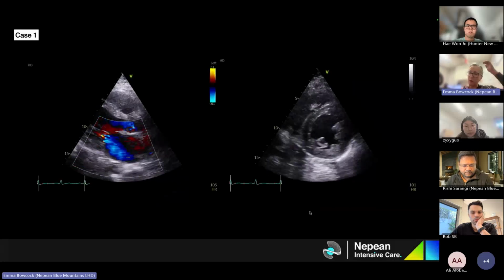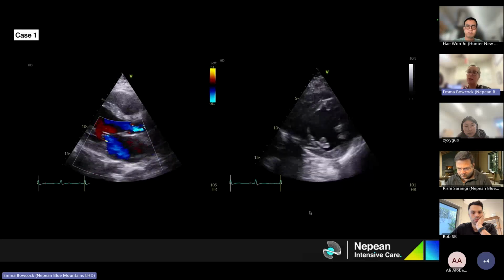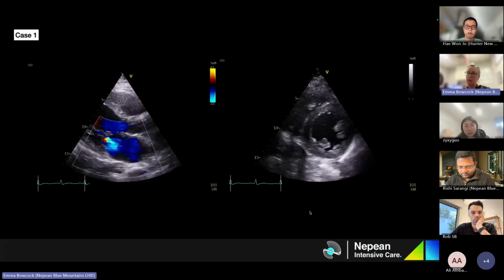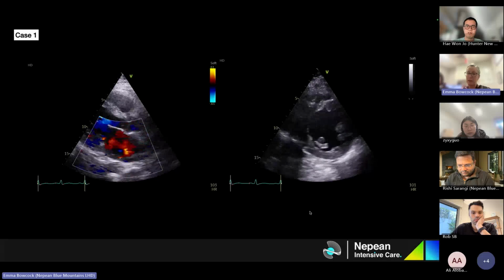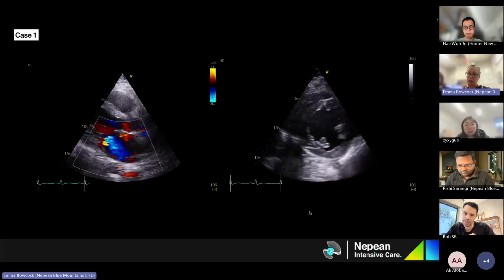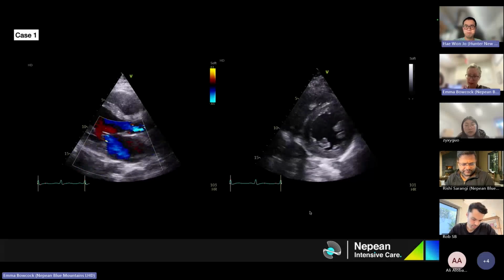I guess that's probably one of the things that you didn't mention, which they might press you for. I didn't show you any diastology purposefully, but I think there's enough information to say that she has raised LAP and she has pulmonary edema. But you said that you would use diuresis, and obviously you're going to be a bit cautious with that because of placental flow and how dependent that is.